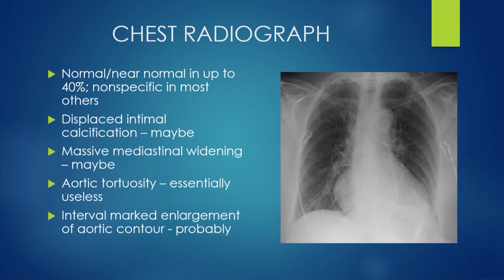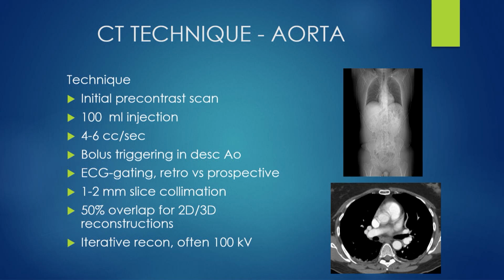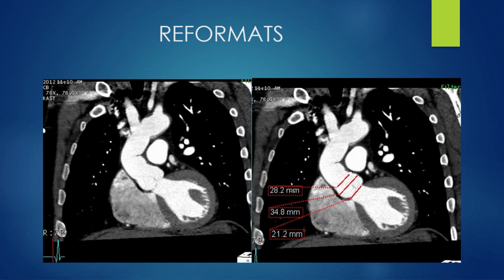However, out of abundance of caution, I'm much more conservative in terms of what I actually say. The technique, you can read here, but the thing I'll mention is we try to do ECG gating with these because of the pulsation artifact, which you can actually see at the bottom right, that can limit your assessment. And there have been times where others in the practice, let's say, have not done gating, and we've had to repeat it because we couldn't tell for certain about the pulsation artifact.